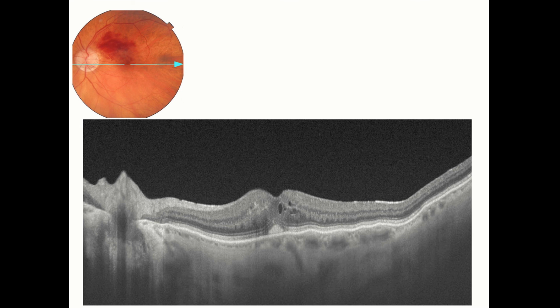So this is another patient with diabetic maculopathy, but this was slightly less in amount. Probably this is more of a lipofuscin type material and a hard exudate type of material. This was not diabetic retinopathy, but a supratemporal vein occlusion in this area, which we initially thought could be lipofuscin, as in a disease such as vitelliform disease, but it is actually subretinal. In the subretinal space, you've got blood in this area, which will always look white as well.